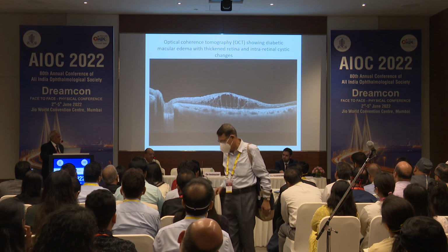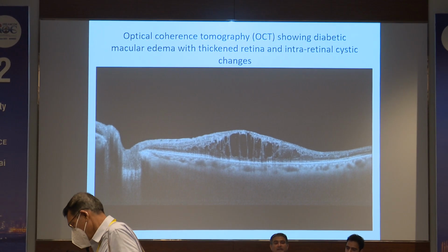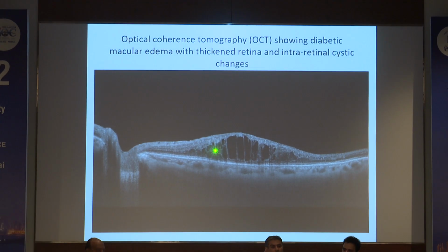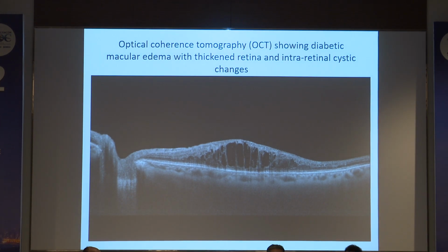I'll finish this very quickly. The point here is, this looks like a degenerated retinal tissue. So if you start giving anti-VEGF, a lot of times you are going to fail. These are the patients where first of all you have to prognosticate. Tell them that even if we treat, you may not recover your full vision. The retinal disorganization will improve and some vision will recover, but he may never gain the full vision because of the obvious loss of the ellipsoid zone. So these are very good candidates for steroid usage.